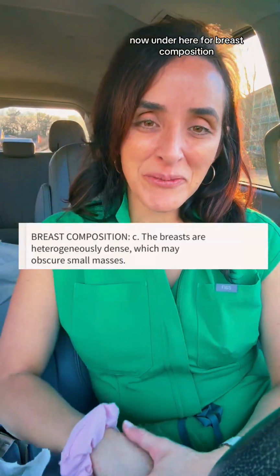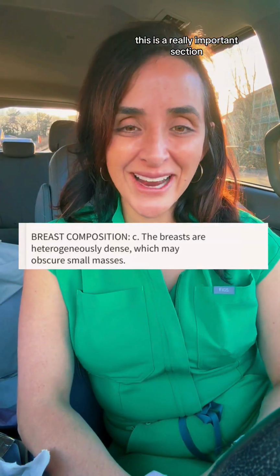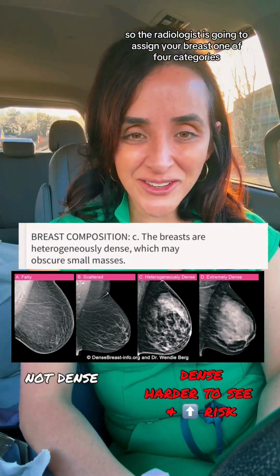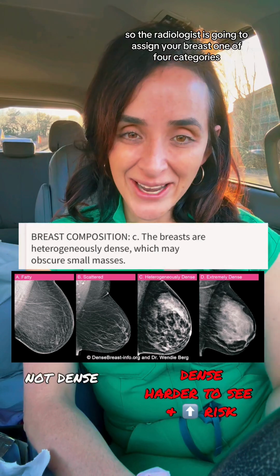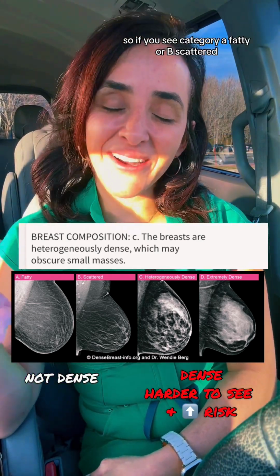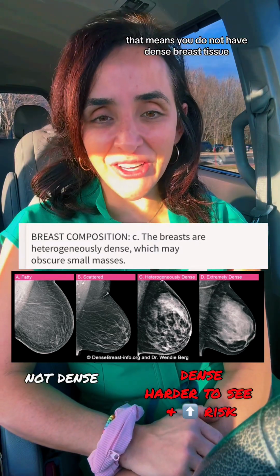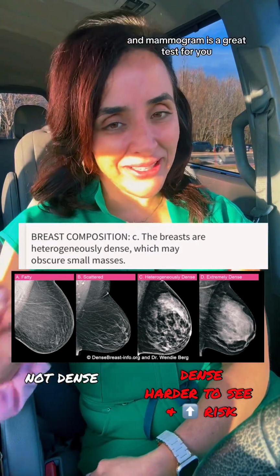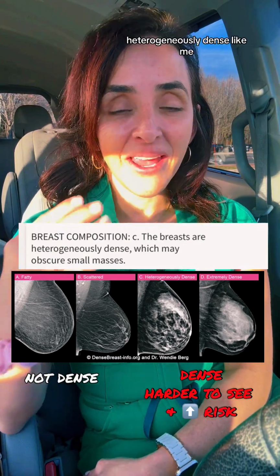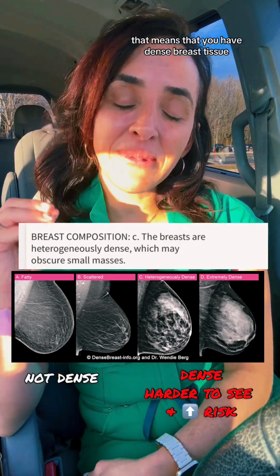Now, under here for breast composition, this is a really important section. Here is where you're going to find out if you have dense breast tissue. So the radiologist is going to assign your breast one of 4 categories. If you see category A, fatty, or B, scattered, that means you do not have dense breast tissue, and mammogram is a great test for you.